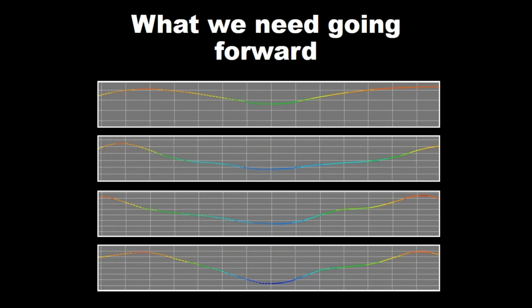So making sure we create that optimal myopia controlling shape is one of our considerations when we use Ortho-k lenses for adolescents. And having a flat, low plane shape like this, having very little shift from most minus to most plus, may not be the most optimal myopia controlling shape. Having a more radical shift from most minus to most plus in the periphery is probably what we want to achieve for the vast majority of our kids that we're fitting using Ortho-k for myopia control.